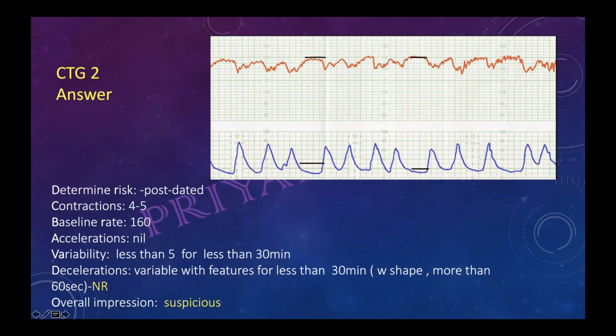For example, for this last CTG, the suspicious one, what can be the management? Like this CTG, I will wait 30 more minutes, for example, she's contracting and already you defined it as suspicious. See, for a suspicious CTG, according to our NICE guideline table, we have to do conservative management. So you have to explain all the conservative management. The management part will come from NICE only.